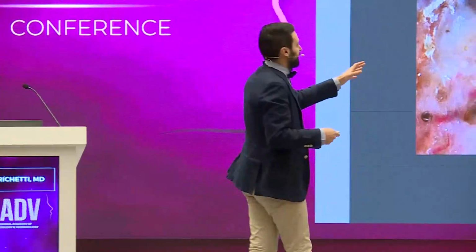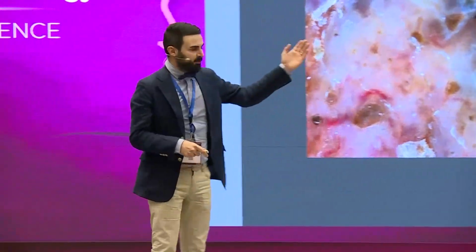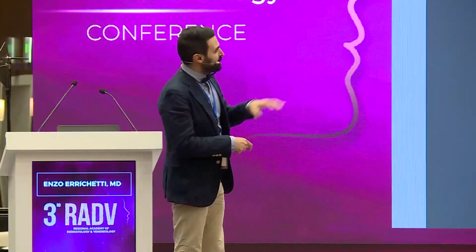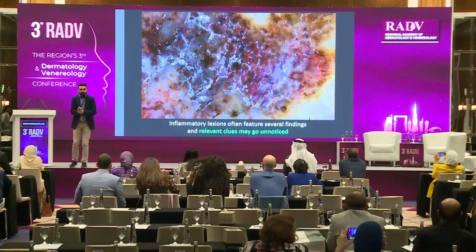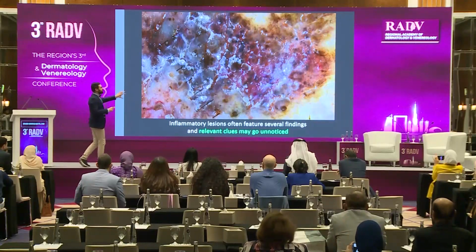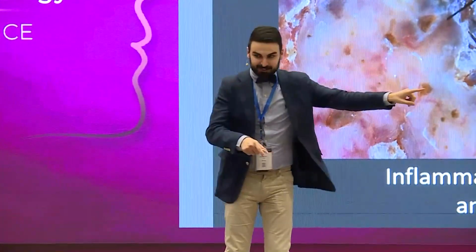For example, here, what do you see? Scales. Then? Pigmentations. Vessels. Okay. May we do the diagnosis? No, I don't think so. But the problem is that, especially when it comes to inflammatory lesions, we may miss something. Okay, you missed something indeed, but we will see.